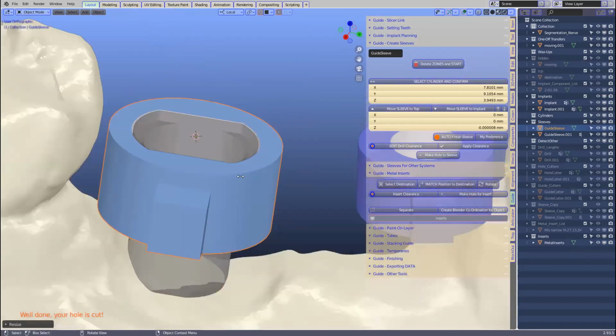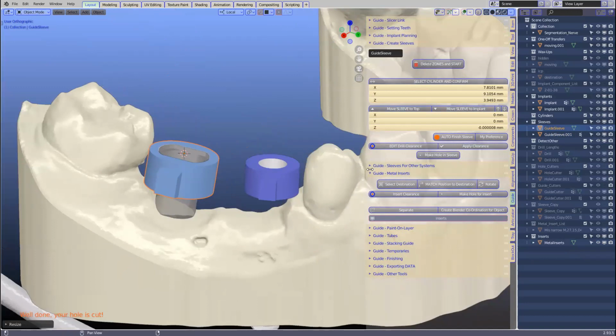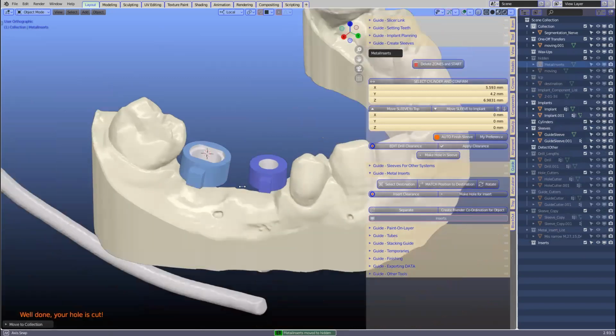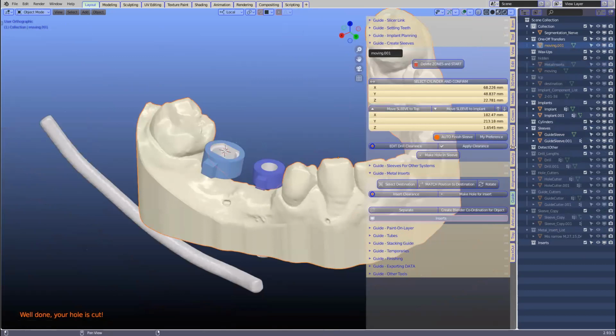Good. So we're going to go to the next chapter now. So you can hide the cutting tool now, Michael. Yeah, this cutting tool, we don't need it. So what I'll do is I've always got a hidden folder where I just chuck things into the hidden folder, and then if I can find it now. Here. Okay. So, okay, we're going to go to the block art.